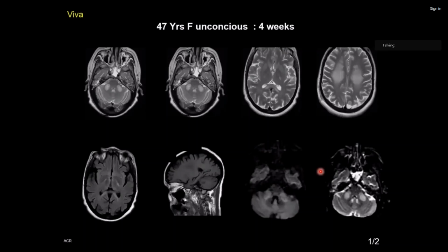Over to you. I've got multiple series of FLAIR axial and DWI axial of a 47-year-old who has been unconscious for 4 weeks.